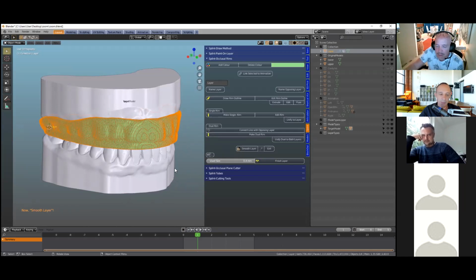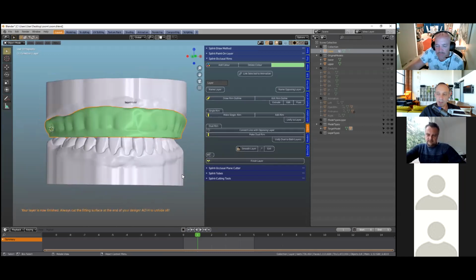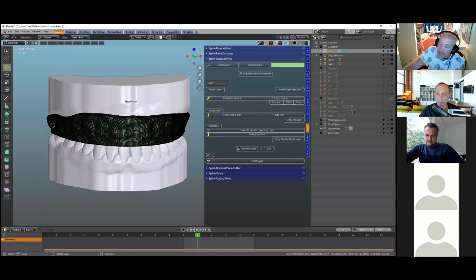So it's just something to keep in mind. So, Michael, is the purpose for all of these remesh functions to make sure the Boolean operation will be successful in the end? Well, not only that, we want it to print nicely.